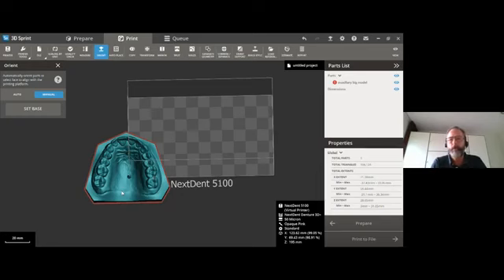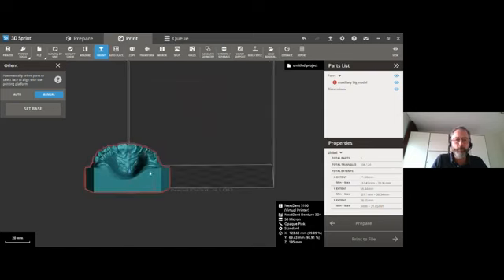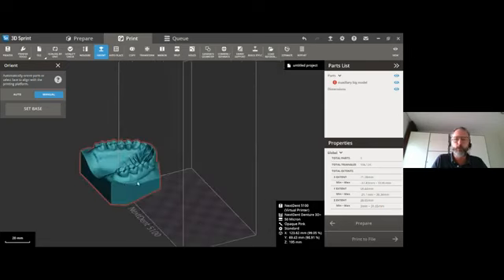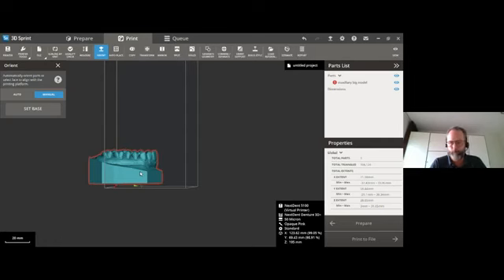And you can imagine that this is also possible for the normal models. So some of the models already come in oriented in the correct way, some of them don't, and it's actually because of a little lack of information in that particular STL file.